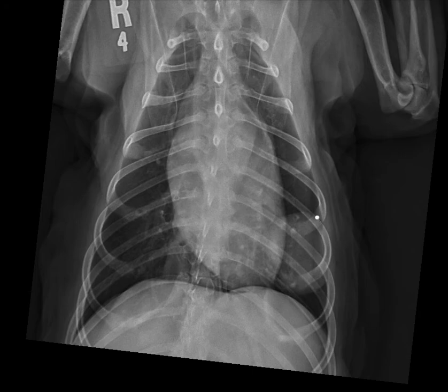So here we have a left caudal lung lobe mass, which is well defined. In a patient of this age, I would have a neoplastic cause as the highest on my list, but sampling would be needed for definitive diagnosis. This can be possible from an intercostal window with ultrasound guidance under skilled operation. So be sure to review the full report associated with this case.